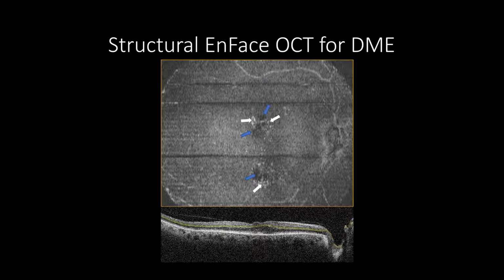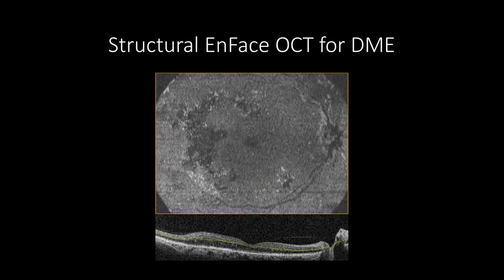In contrast to macular topography, the EnFace OCT can give the edema's accurate location and give a pan view of changes in intraretinal cysts and hard exudates. Please note the blink artifact. This is an example showing non-central diabetic macular edema.